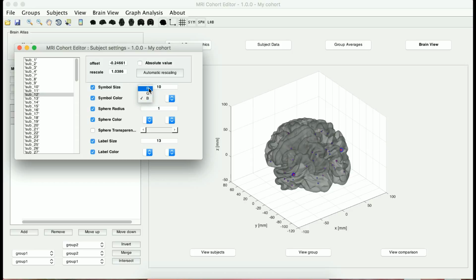Select the colors with the drop-down lists. On the left is the color of the region with largest value, and on the right is the color of the region with lowest value. In addition, you can select the sphere transparency option. Regions with lowest value become most transparent.